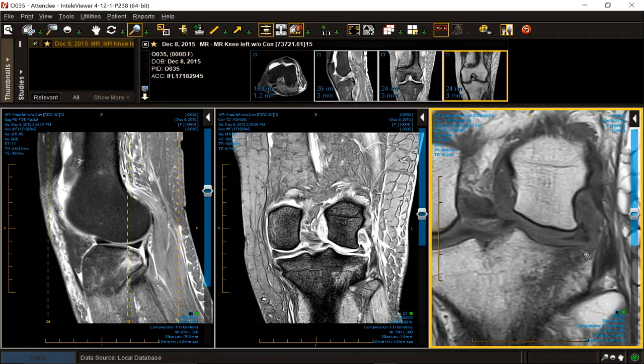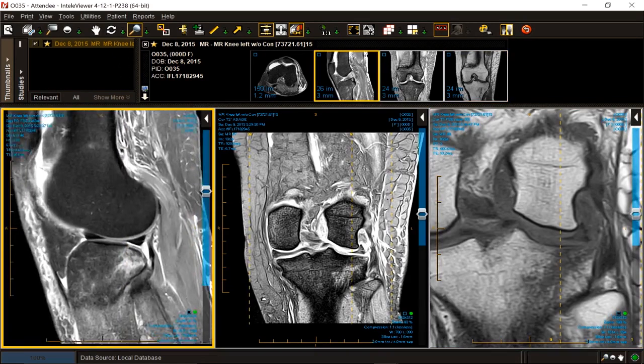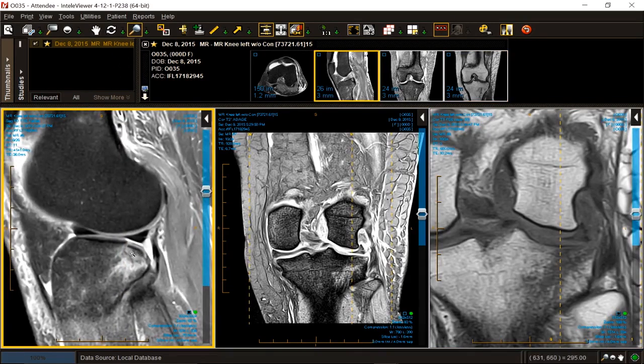You might say, well, why don't I see the line as well? Because there's edema on the inside fragment and edema around the outside. So it obscures the thickness and nature of the fracture. So you might have to go to another sequence, like this water-weighted sequence, and now you see the jagged nature of the fracture and the cortical step-off, which makes it a macro fracture. What else makes it a macro fracture? It's depressed. So it's displaced. It's gapped very slightly at the cortex.